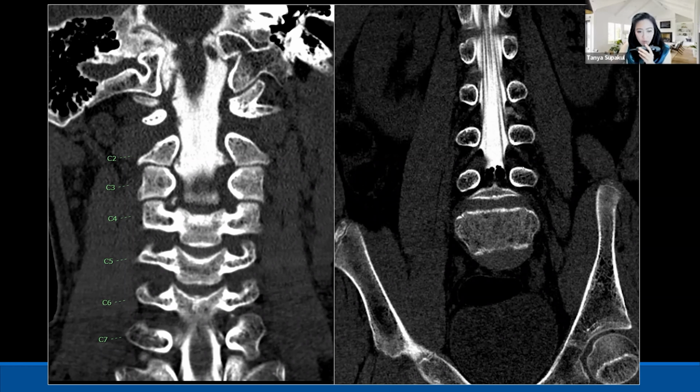the myelogram. But when you look closely, there is some leak of the CSF along the nerve roots here, neural sleeve here. There is some leak here, maybe over there and also over there. And also on the cervical spine, it's maybe a diverticulum or a small CSF leak. So for this patient, we did a blood patch and the patient is getting better.